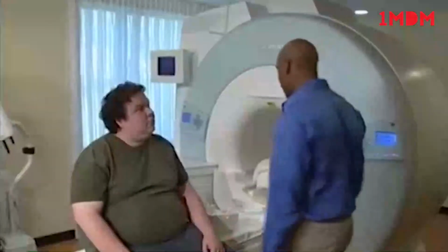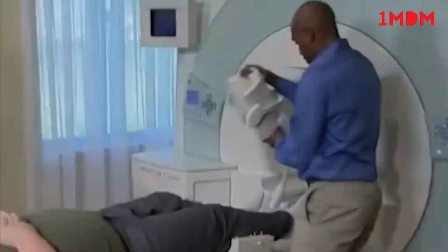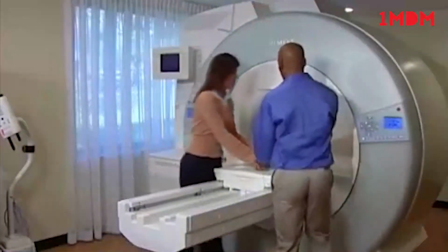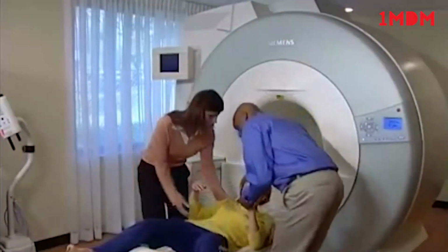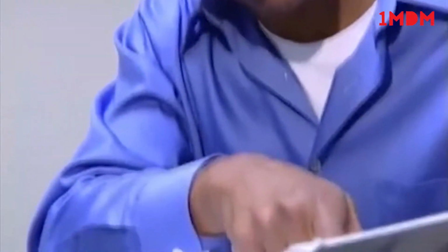This video also addresses proper patient preparation, examination, as well as how to correctly handle the surface coils. Finally, we will show examples of emergencies or accidents and how to avoid them, and how to respond appropriately should they occur. This video serves only as a supplement to a more comprehensive safety training program. Specific MR safety-related information is provided in the Siemens MR System and Operating Instruction Manuals.